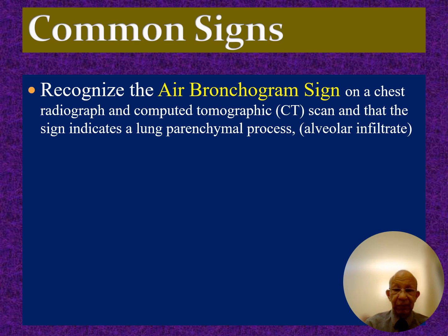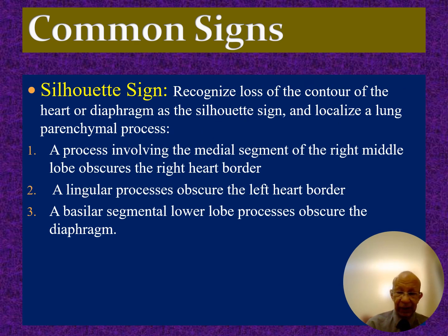Now, air bronchogram means there is fluid in the air spaces of the alveoli, and then there is actually consolidation. The silhouette sign, as I mentioned several times, is the interface between the air and the solid organs, and this should be crisp and clear, right? No haziness. You can just put a pen and go all the way along that line, the silhouette sign.